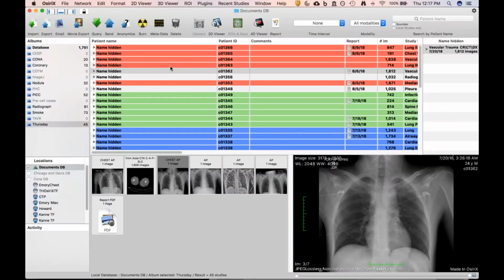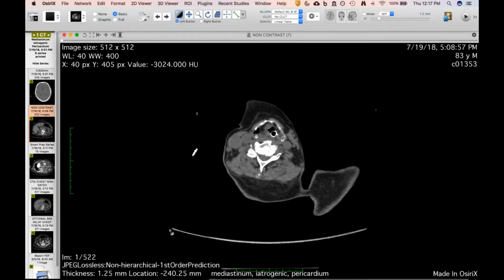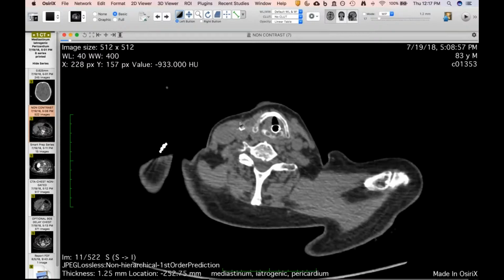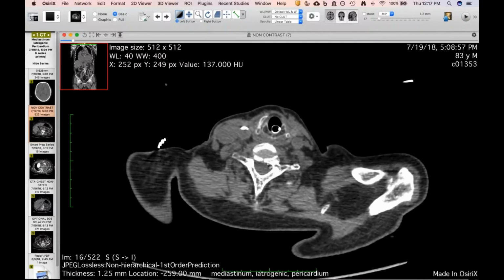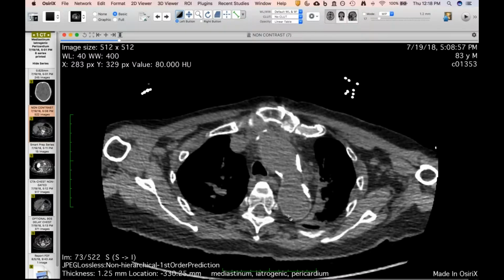Then we had a run of interesting cases. This is one, also an interesting case, and I've got a theory here. This was, as you can see, an 83-year-old man. At this time he came in, or when he had the CT, he was intubated. So he was in the hospital and had apparently a witnessed arrest, and he underwent resuscitation, was resuscitated successfully, and then underwent this CT.